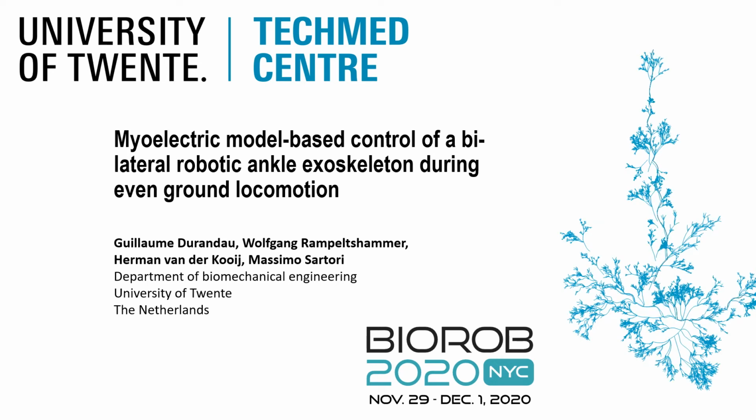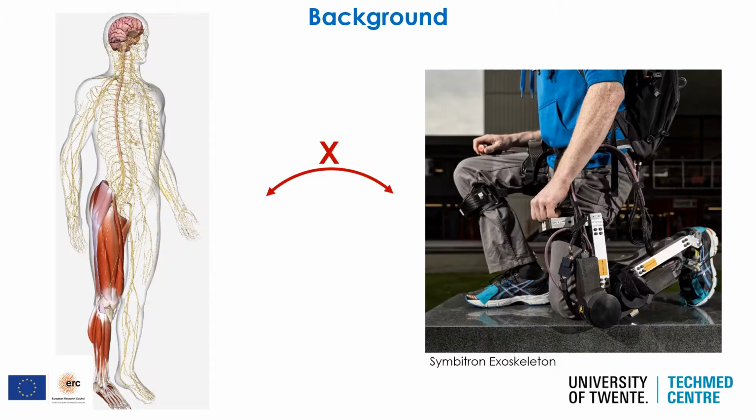Welcome. This video is about our work on myoelectric model-based control of a bilateral robotic ankle exoskeleton during even ground locomotion, presented in BioRob. Finding new solutions for the intuitive control of exoskeletons is a key challenge today. Although research has led to sophisticated robots, these devices cannot be controlled directly by the subject.